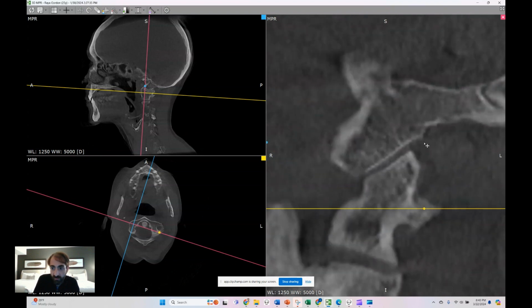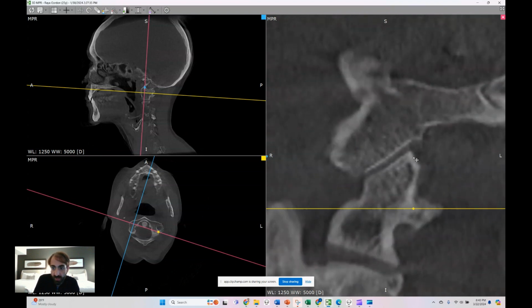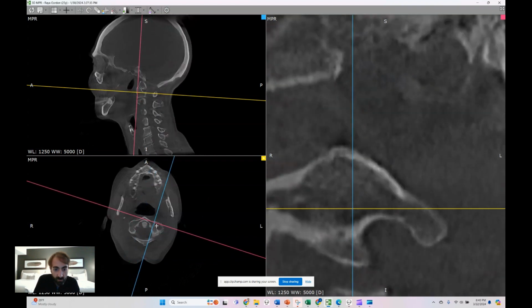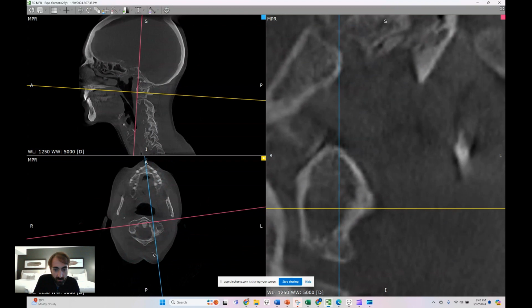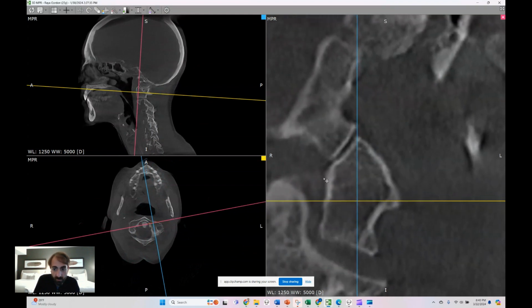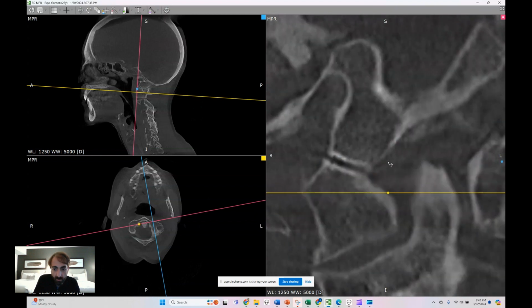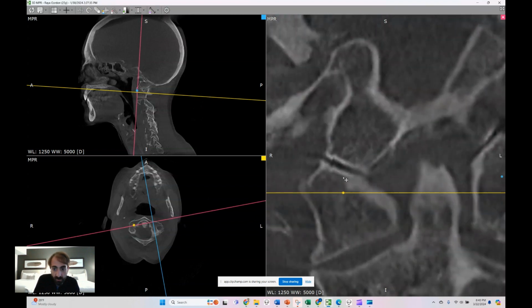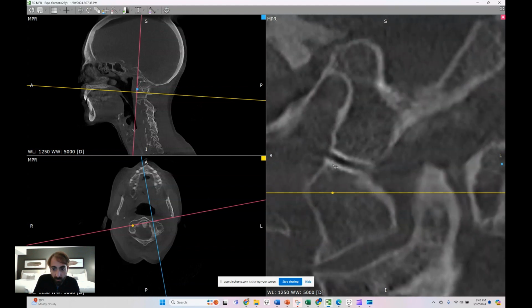It's hard to say. That really does not look like it's jutting out on the left of me at all. That really looks like much more of a right laterality to me on a Blair view.